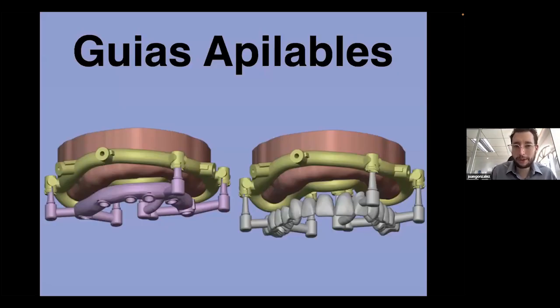And now, what about these stackable guides? This is a very popular procedure right now. It's getting very common, and Blender for Dental has a full workflow to design this sort of guide. Actually, you can have as many layers, as many different pieces in the lower part as you like. And you can convert the upper into a plastic piece or a metallic piece.